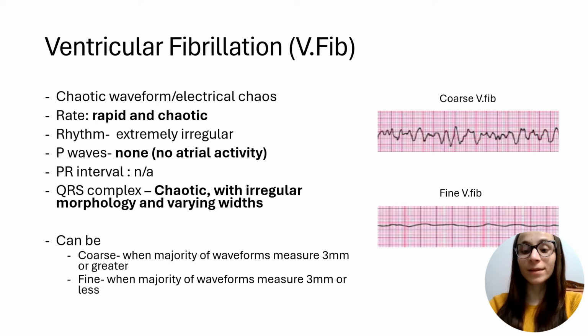So talking about VFib, now we're up to VFib. VFib is ventricular fibrillation, and you remember with AFib, we were talking about how the atria were just quivering and weren't effectively pumping out. Over here it's the same thing, just with the ventricles. So the ventricles of the heart are just fibrillating. They're just quivering, and this prevents the heart from pumping blood effectively to the body. So you're going to have a rapid decline in circulation, and it could lead to cardiac arrest.